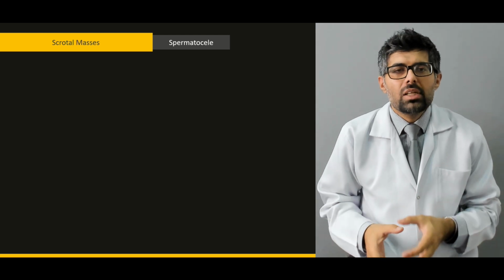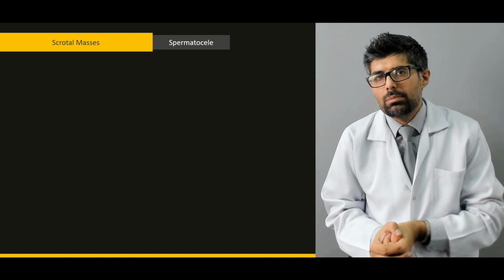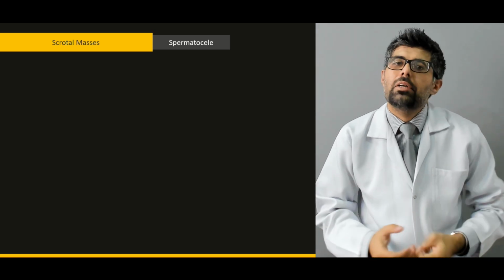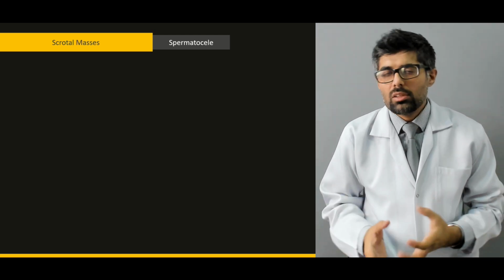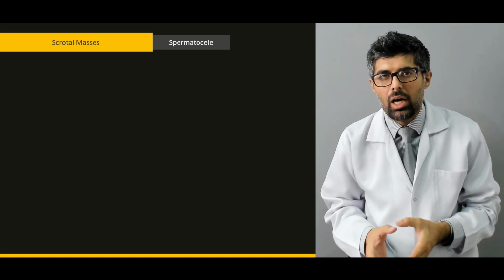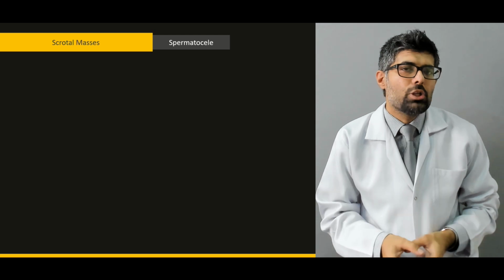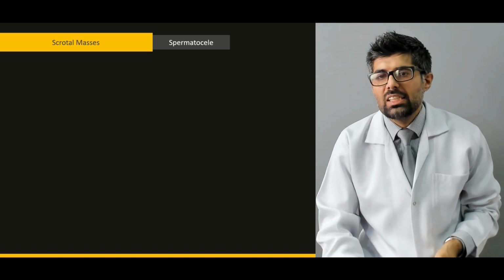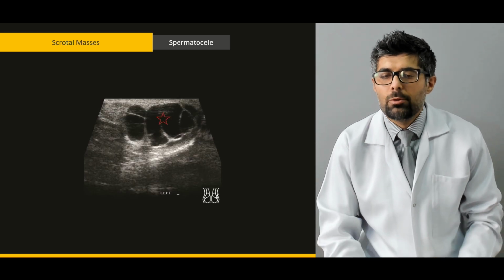Now, scrotal masses are usually of two types. They're either extratesticular or they're intratesticular. Now, extratesticular masses are usually considered benign and intratesticular masses are usually considered malignant. Now, here we have an example of a spermatocele.